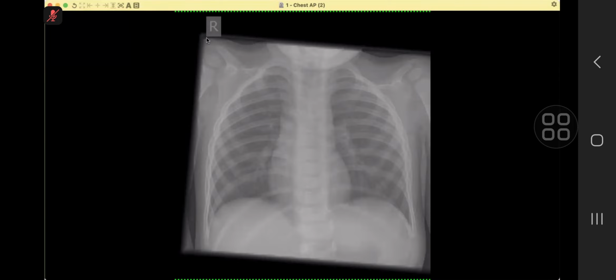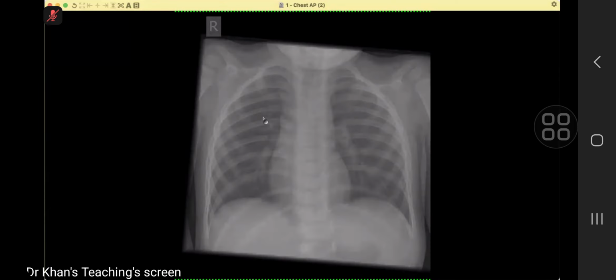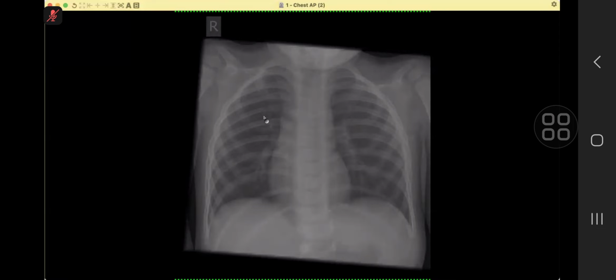I believe, if you can see the screen, I think this is the first strip. And maybe I would like to see on any other window. And also, I can appreciate that the aortic knuckle is not very prominent where it should ideally be. So if I can change the window, or if I can see any other previous study. Sorry, you are interested in looking for what? Change of window means? So I've changed it slightly.